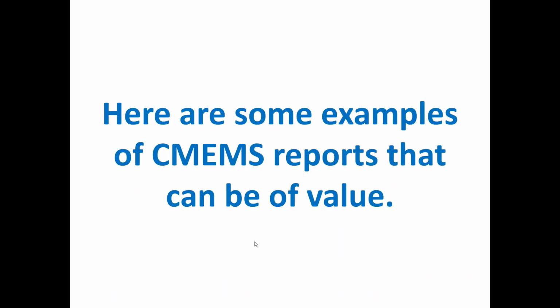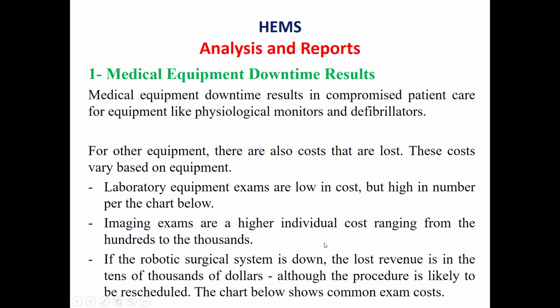Now we'll see some examples of these generated reports. The first example is about the medical equipment downtime report. Downtime can have an impact on patient care. For example, in the case of a physiological monitor or defibrillator, it will compromise patient care.